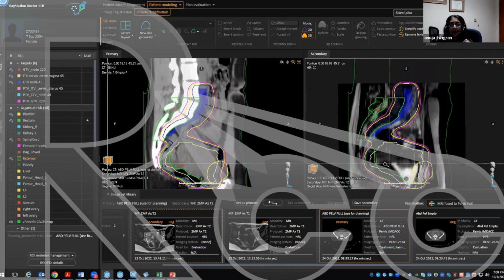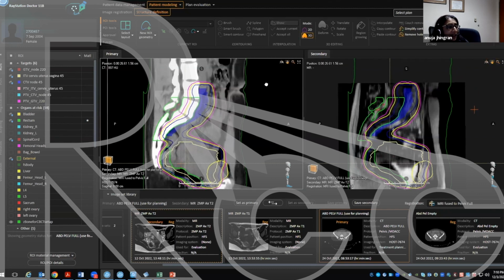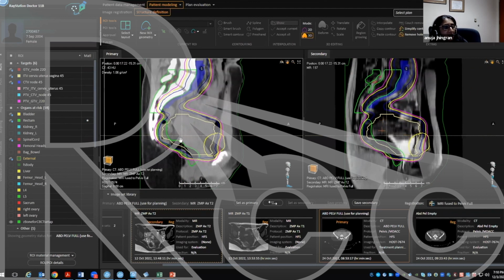If it stays backwards, and I know you can't see it very well, but this is the uterus right here, and you can see the uterus on the CT really well. You can even see the line of where her tandem would go, right? So if it stays retroverted at the time of brachytherapy, what do you do?